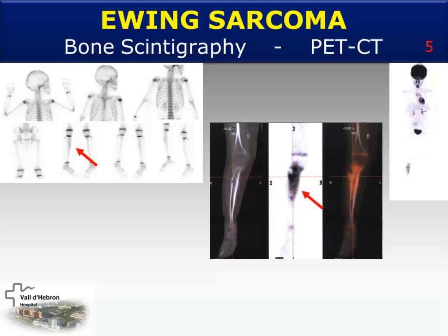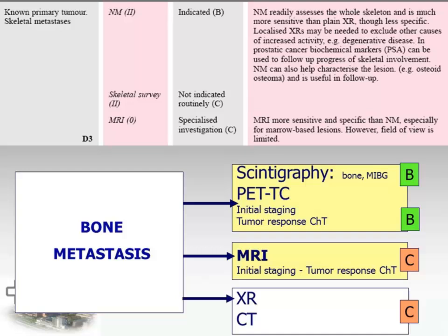Look at the image with PET FDG and compare this uptake with this one. I think that in the future, I don't know if you agree, but I think that in the future the sarcomas will be followed with FDG and not with bone scan. And some words about the bone metastasis.